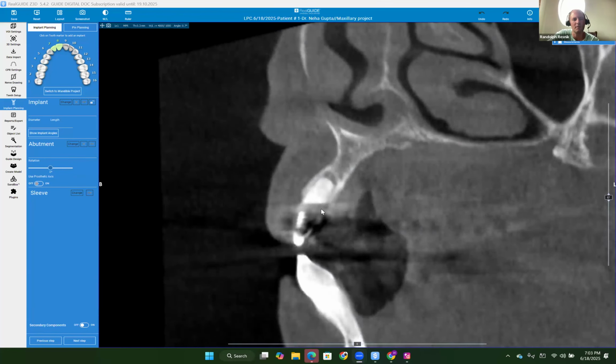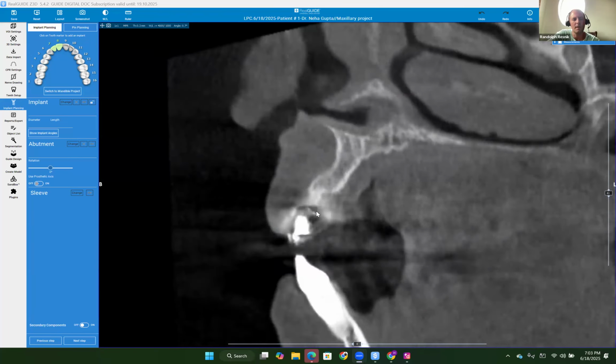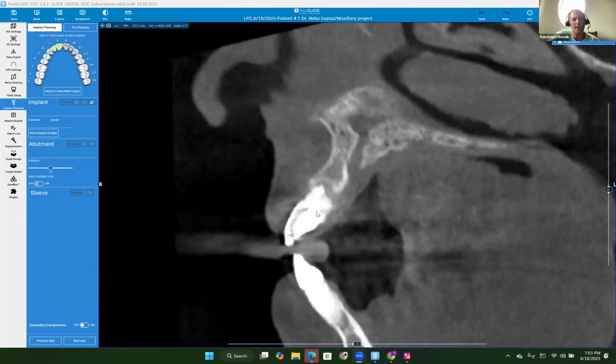So here we go, this is 7. There's the periapical radiolucency you see there surrounding the apex. And then Doc, both these teeth are mobile. Do they both have resorbed roots? Yes. Okay. Yeah, because the root on number 8 looks very, very shallow there. And you said they're class 3, 4 mobility? Yes. Okay, perfect. So that's number 8 there. And the patient's 84 years old, correct? 84-year-old. Okay, perfect.